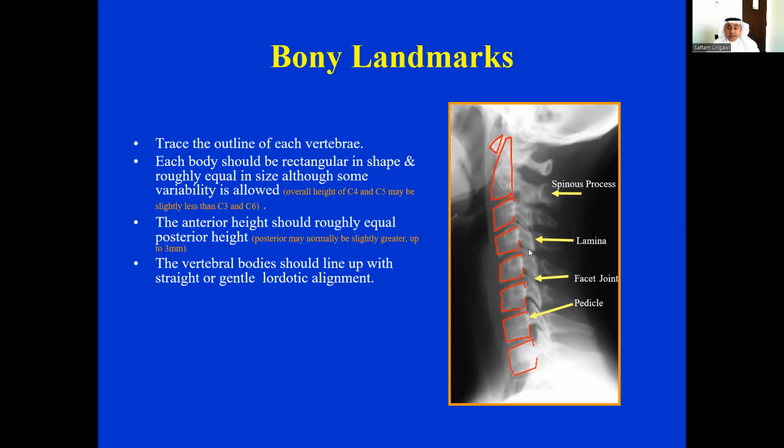The next step is to evaluate the spinous processes, the laminae, the facet joints, and the pedicles for any sign of malalignment or disruption.